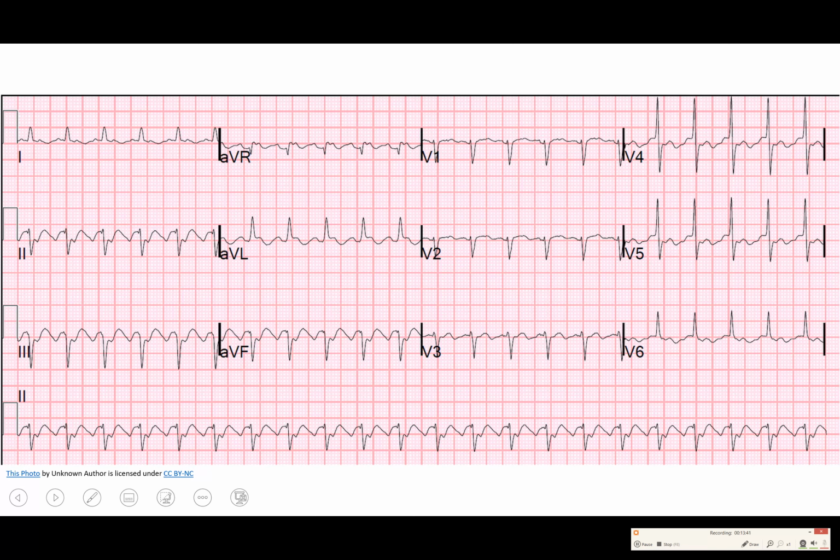Okay, this next one, we're going to look at a series of full ECGs now, just to give us practice seeing them, the full ones that you'll be reading in the future. But remember, because we're doing our systematic approach, we're only going to look at the rhythm, especially for the sake of this lecture. You have learned how to do the rate if you looked at the previous lecture, so we could also look at the rate.